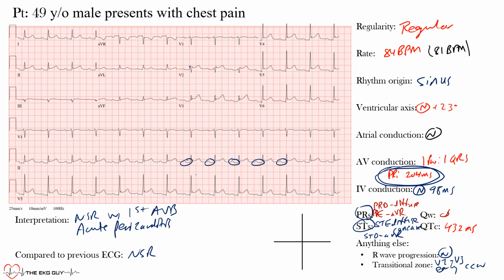So the main ECG features you see in acute pericarditis are diffuse concave up ST segment elevation and PR depression, throughout most of the limb leads, as we saw here, as well as the precordial leads, V2 to V6. We see reciprocal ST segment depression and PR elevation, as we saw in aVR and V1, plus or minus V1, not so much here actually, so mostly aVR. And patients may have sinus tachycardia. In this case, he had normal sinus rhythm.